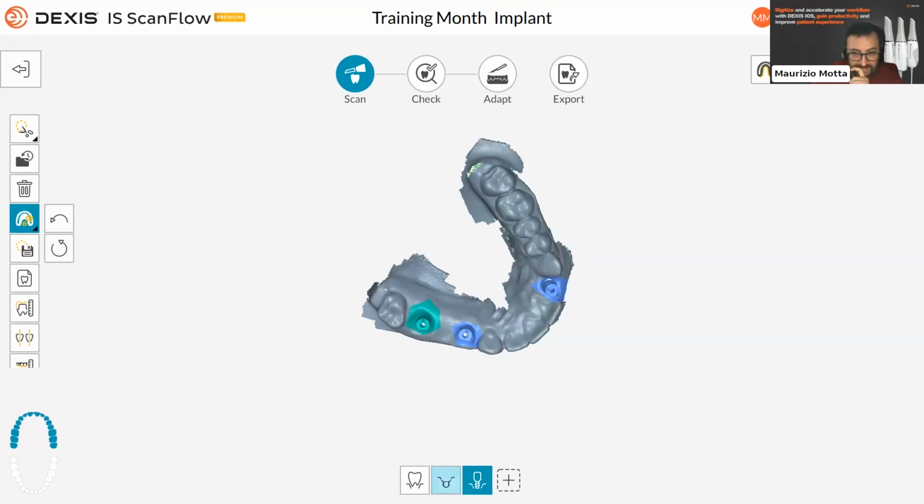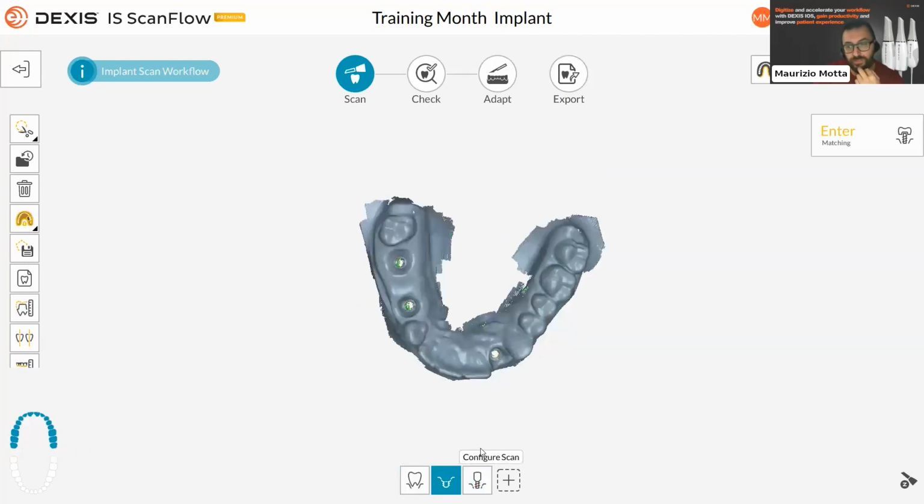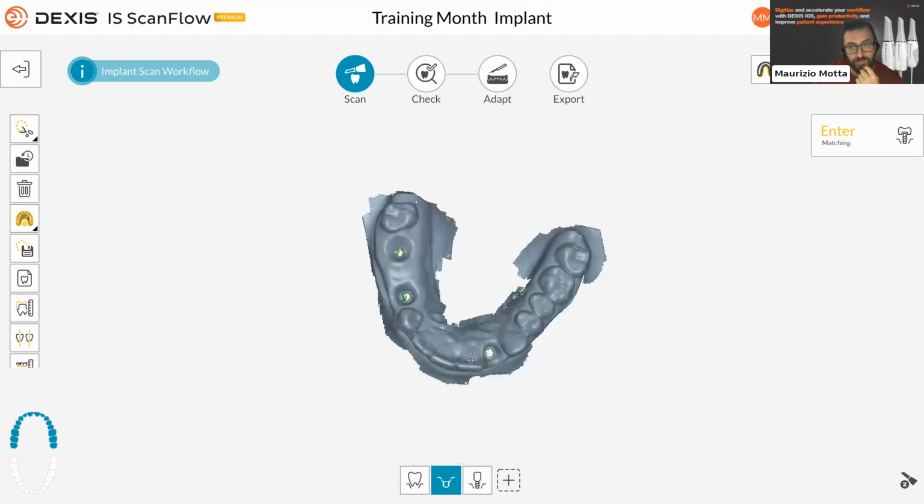Last but not least, in case you have a hybrid case, like with implant and restoration, the suggestion is to use the Emerge Profile tab to scan the restoration, because this one will be the file that will be used by the lab to then design the actual prosthetic.